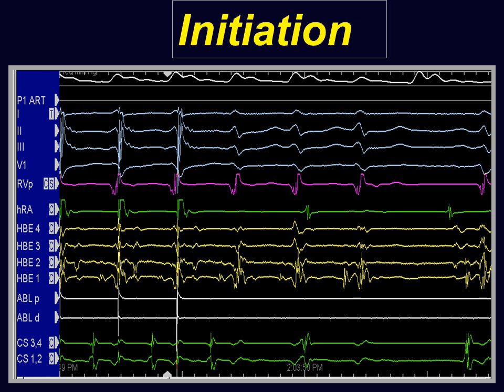So this is what's called a 2-for-1 response, where you have two QRS complexes for one single atrial extra stimulus. There are patients who can have this continuously, called the 2-for-1 tachycardia, and they can mimic atrial fibrillation, and after ablation of the slow pathway, this usually disappears.